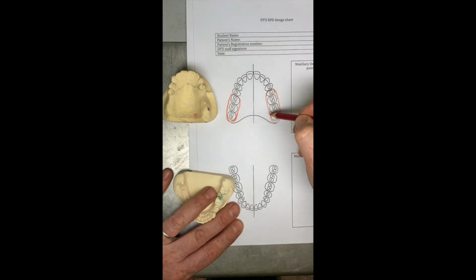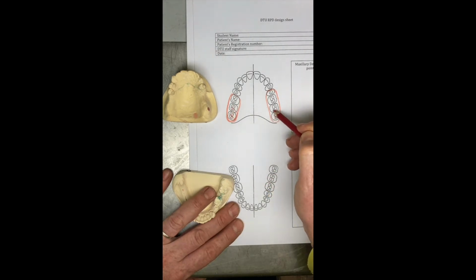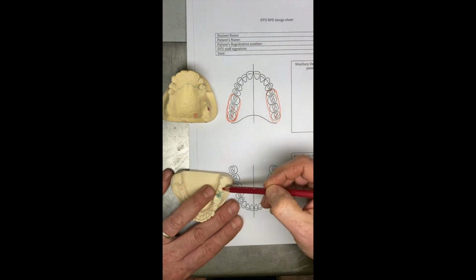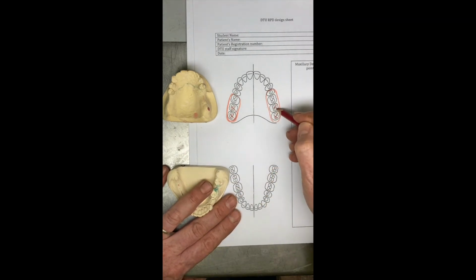And then when we have mucosa supported portions of a denture, we want to limit the occlusal table as much as possible, so we can certainly take off those and probably take off the 7s as well. We may want to incorporate a 7 on this particular design because we've got an opposing tooth down here, but by default we try and get rid of it. Makes life a lot more simple.